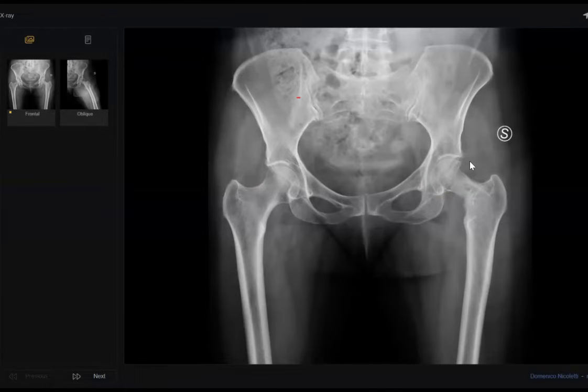Sir, I will further see it on the MRI because there is bony scalloping that is causing narrowing of the femoral neck. I would like to see the soft tissues on the MRI because I can see that the soft tissues are bulky and the fat planes are blurred. Give me any differential diagnosis. Soft tissue sarcoma.